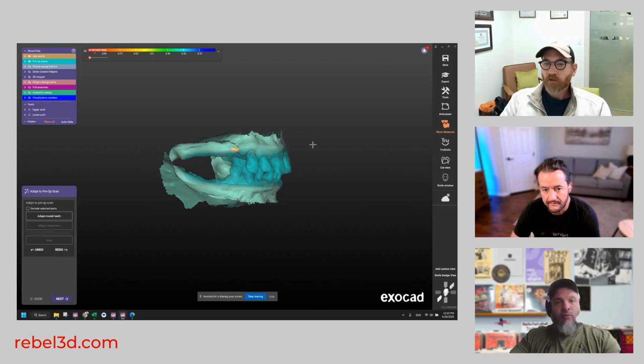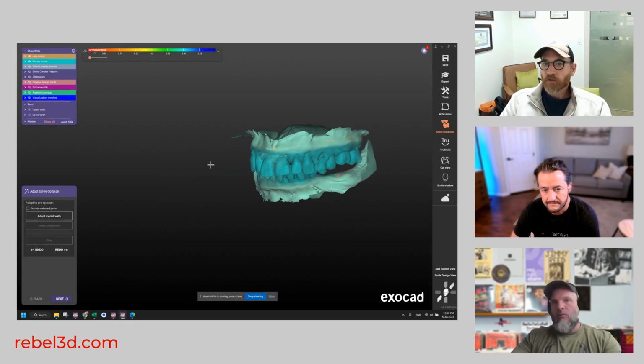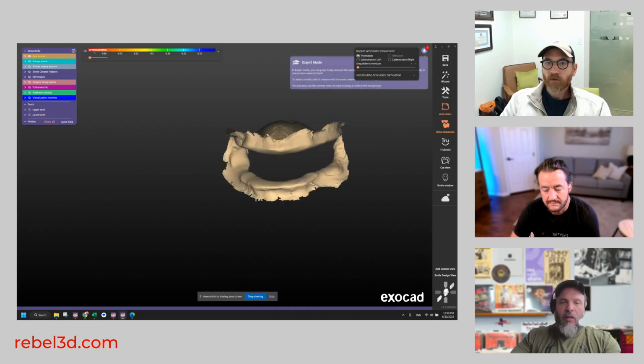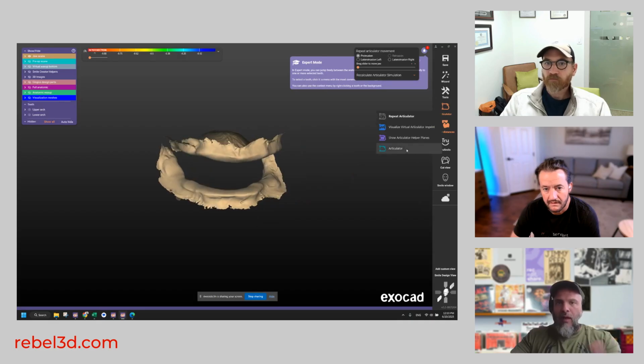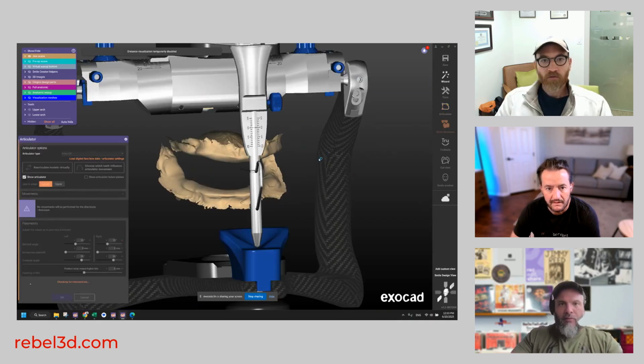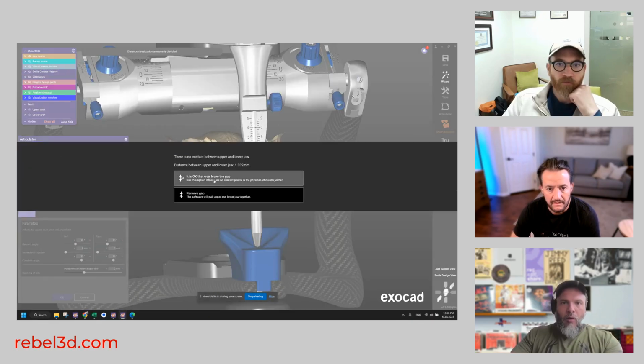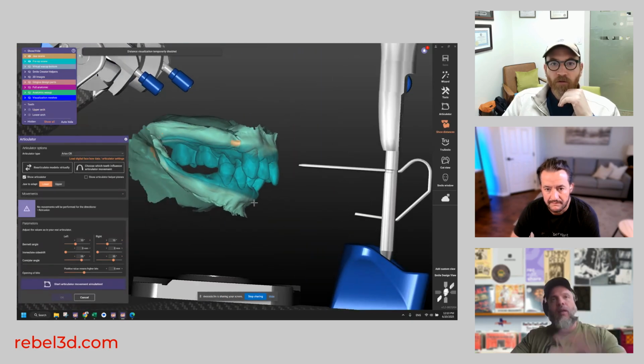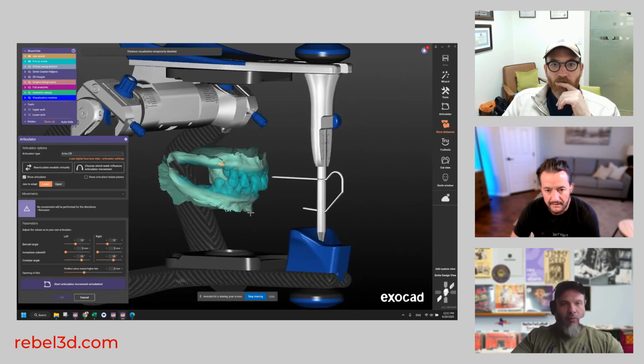Now, because I have no objective data at all but the intraoral scans, all I am left with is to open the articulator. There's going to be a bunch more data that shows up here, and I need you to ignore that as I go through this process. But all of the data that I have to do the alignment is this. Dr. Sven had already mounted this, so that's why it's in the correct position in the articulator.